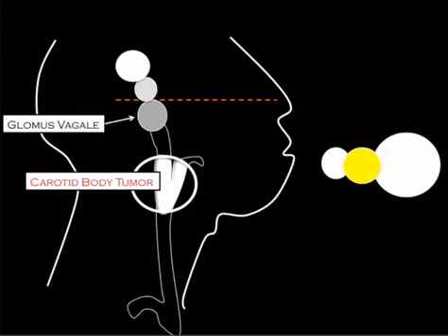It's pushing the external and internal carotid apart from each other. So it's a classic way to show that. The one that you probably have not seen, and the reason you haven't seen it is because it's, well, let's finish talking about the carotid body tumor first. So it pushes apart. This is the most common one. It's the most common one shown. It's the most common one in books because it's the easiest one to get pictures of.